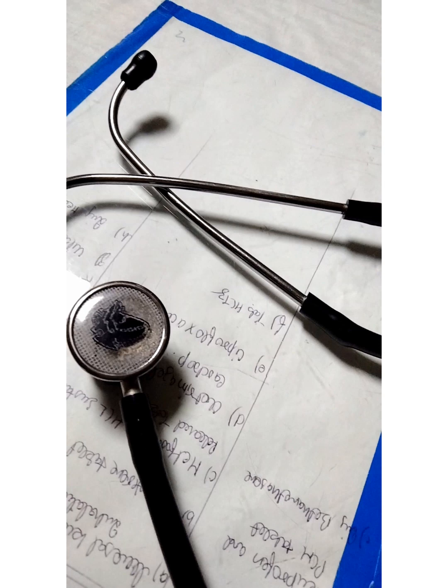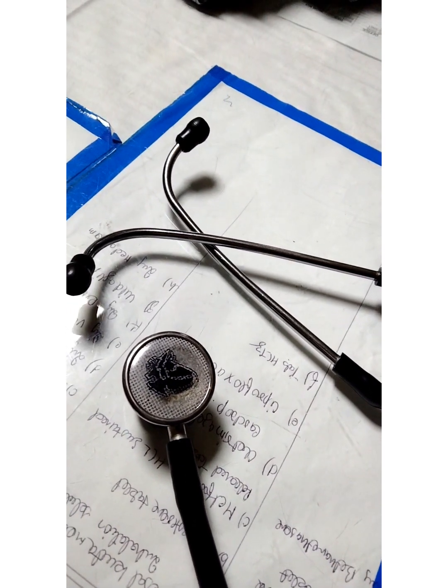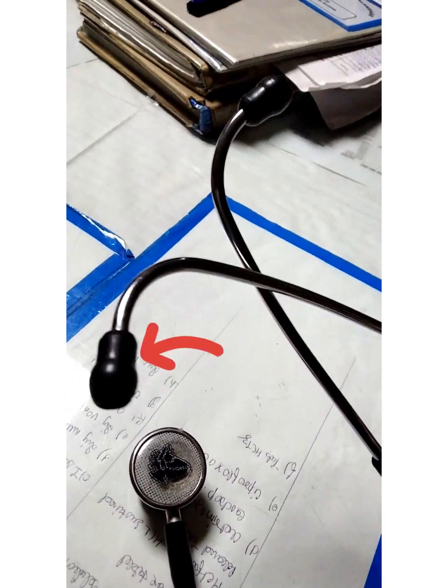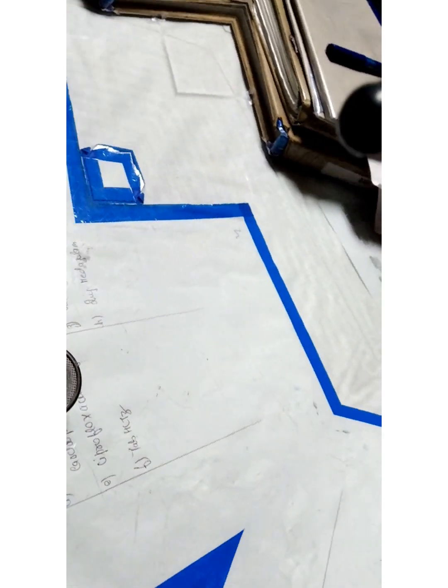After that, there are two curved parts connected with the tubings, known as binaurals. At the top of stethoscope, there are two ends which are put inside the ear to listen to the sounds. These are known as earpiece.